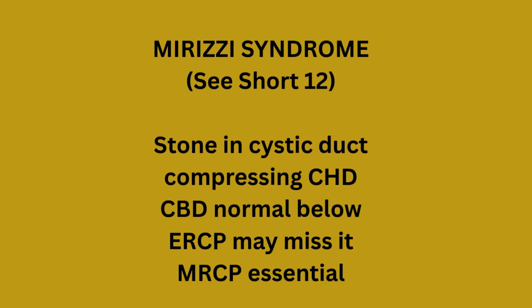Mirizzi syndrome. Stone in the cystic duct compressing the common hepatic duct. Trap: the CBD is normal below the cystic duct insertion. ERCP may miss it completely. MRCP is essential to map the anatomy before surgery.